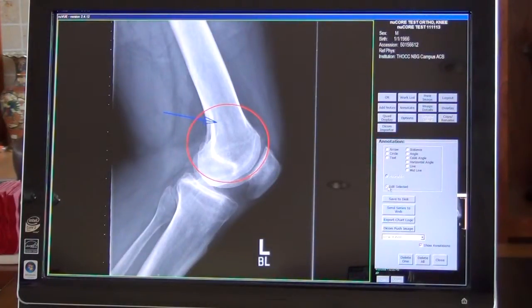Again, I'm in the edit mode, so I come back, touch the graphic that I want to readjust, and reposition it, or resize it, or reshape it. For the arrow, click on the arrow and then choose one of the nodes, draw it down, release, and it's been adjusted to where you want it to be.